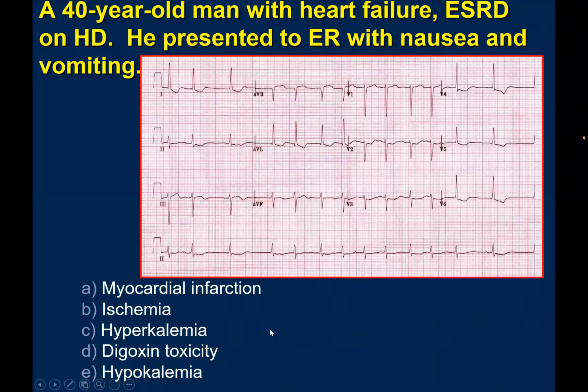So what do you think of these possible differential diagnoses? It looks like the rhythm is irregular. There is no P wave, so probably maybe atrial fibrillation. So this is atrial fibrillation also, because once you don't see P wave and rhythm is irregular, narrow QRS complex, number one diagnosis is atrial fibrillation.